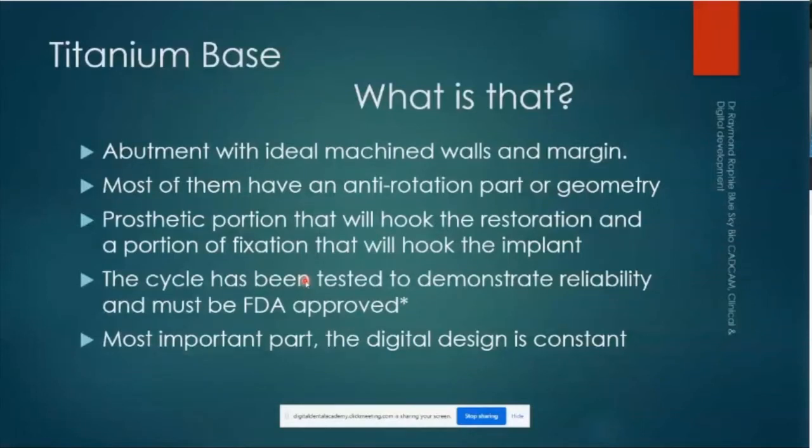The most important of everything is that they will have a library in the software that you're designing, with the minimum thickness and how the tools are going to actually mill the inside of the restoration. It's always constant and with a very good result.